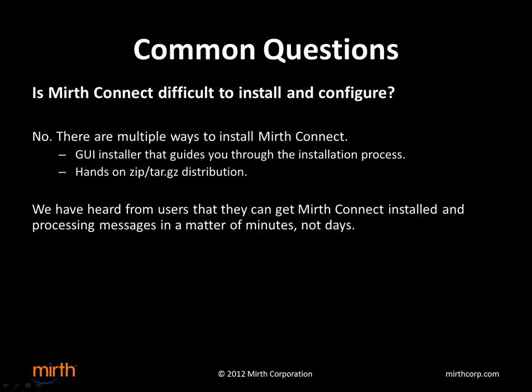We also have a lot of people say, oh, Mirth Connect's open source. That means it's difficult to install and configure. This is definitely not true. There are many ways to install Mirth Connect, and I'll give you an example of installing Mirth Connect and setting up to process messages in just a couple of minutes.